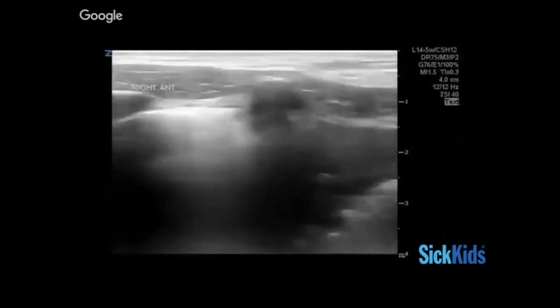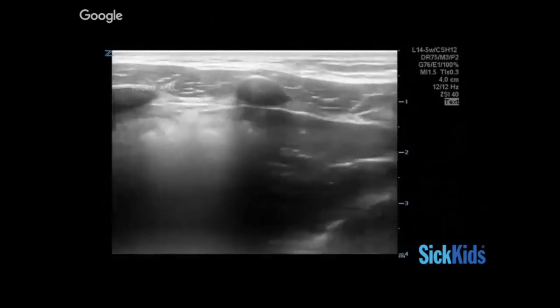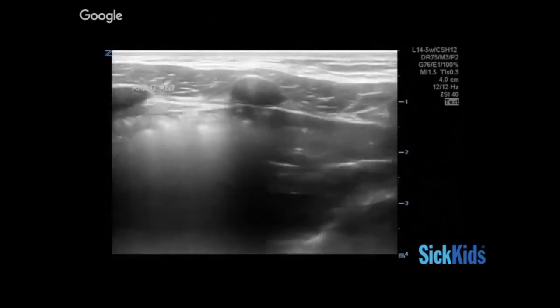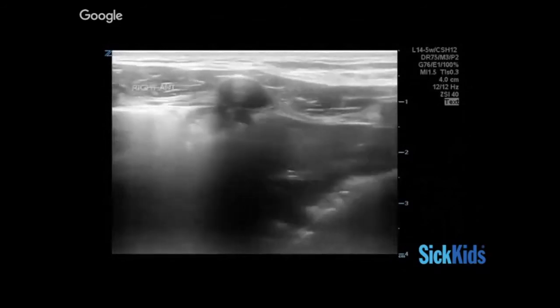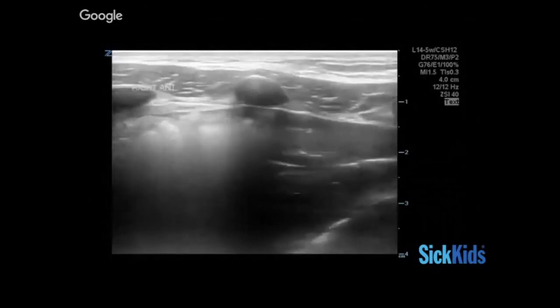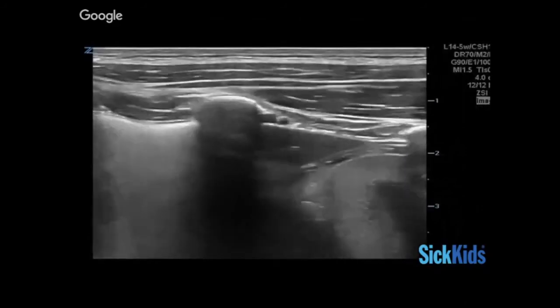Here's another example where on the left side of the screen, you get a bunch of confluent B lines, which could be non-specific, but then in many situations, when you're following these confluent B lines, you get true pathology, in this case, a large consolidation. Here's another example.